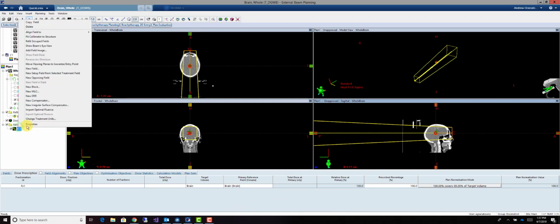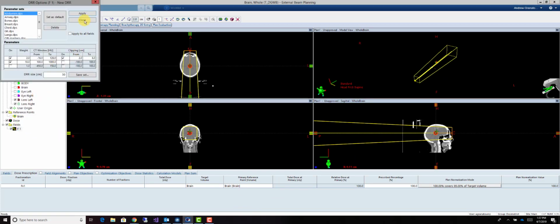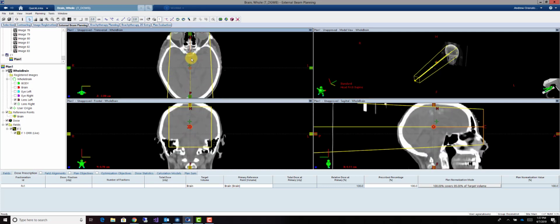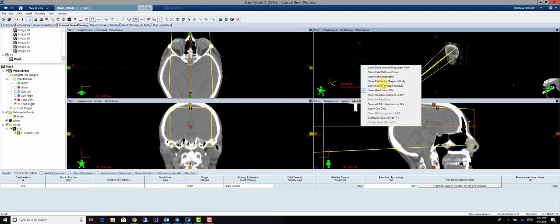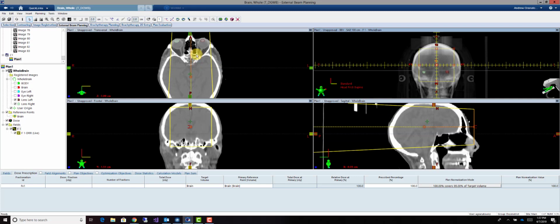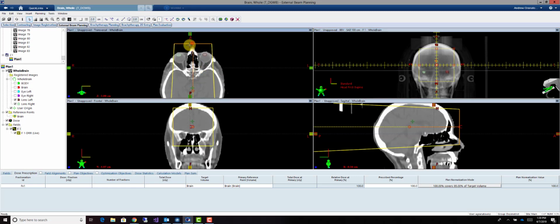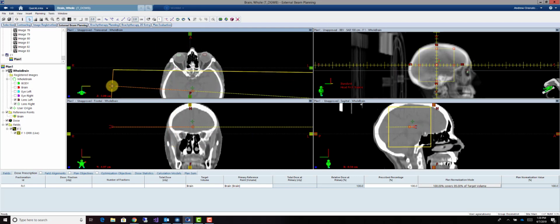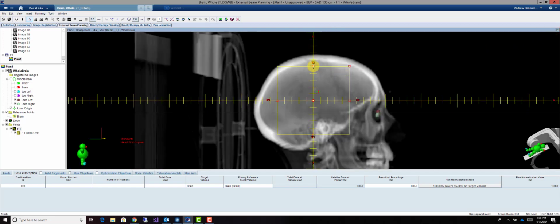We'll leave our isocenter in the center of the brain. To select our gantry angles, we're going to navigate to the slice where the lenses are located. What we want to do is rotate the gantry so that there is no divergence from either side into the opposite lens. The first step will be to look at our 3D beam's eye view and then rotate the gantry such that the 3D view of the lenses are right on top of each other. As you can see in this picture, we rotated those gantries until those lenses were on top of each other.